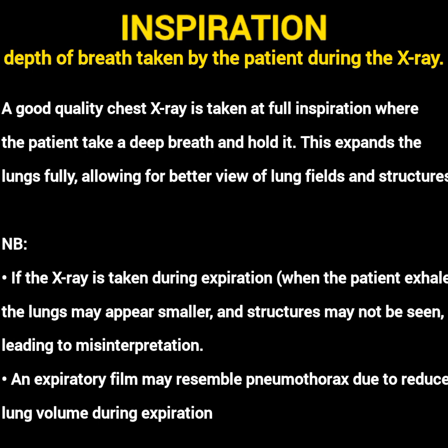You note that if the X-ray is taken during expiration, that's when the patient exhales, the lungs may appear smaller and the structures may not be seen, leading to misinterpretation. And also, an expiratory film may resemble pneumothorax due to reduced lung volume during expiration.